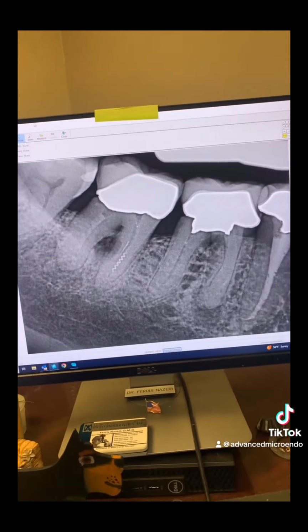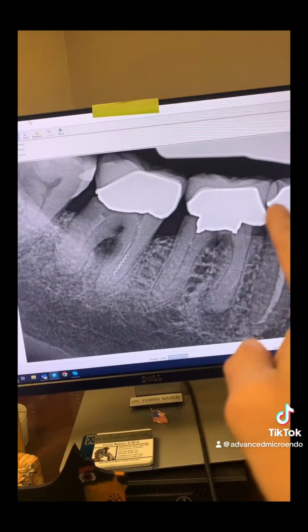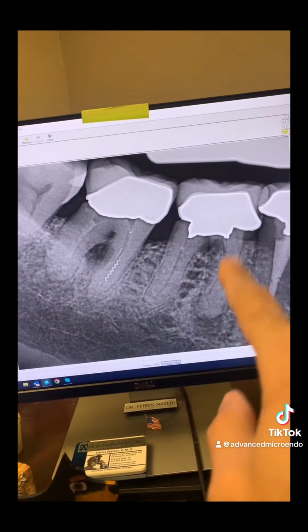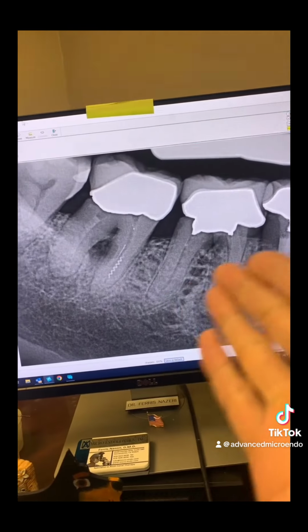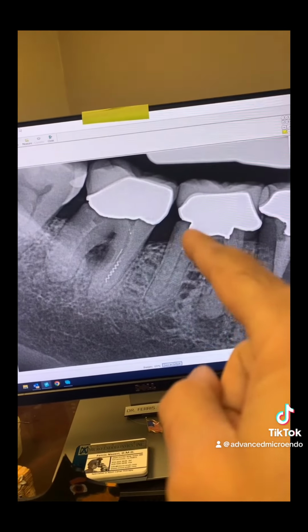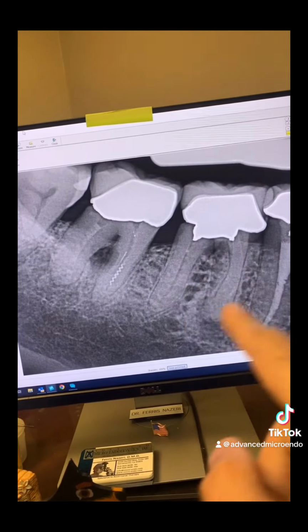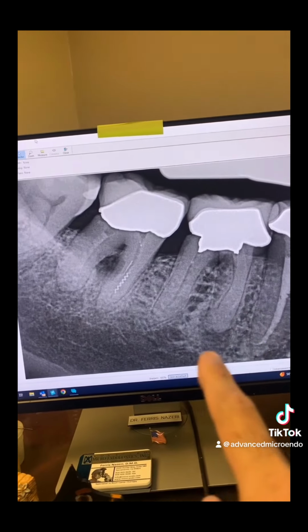Okay, so take a look here. Look at tooth number 30. Let's start from the top. So there's a crown on the tooth here, as you can see, some kind of a metal buildup. These are Russian root canals, so the material they use is Russian red paste material, okay? Perhaps open margin there. And as you can see, the kind of root canal, as I said, that they do in Russia, periapical lucency here.